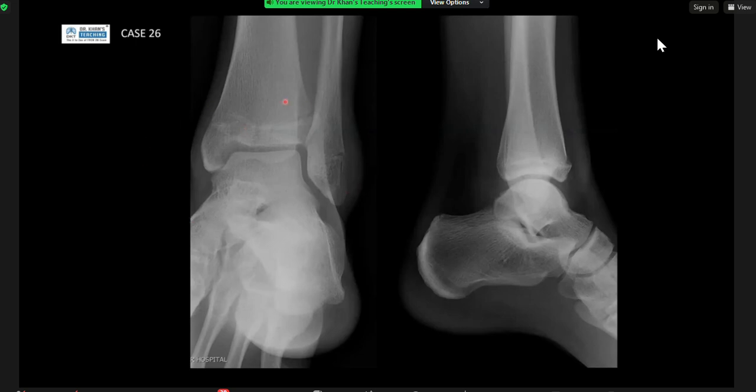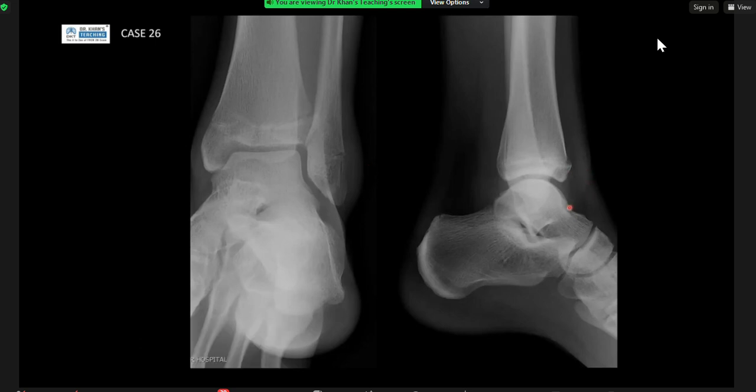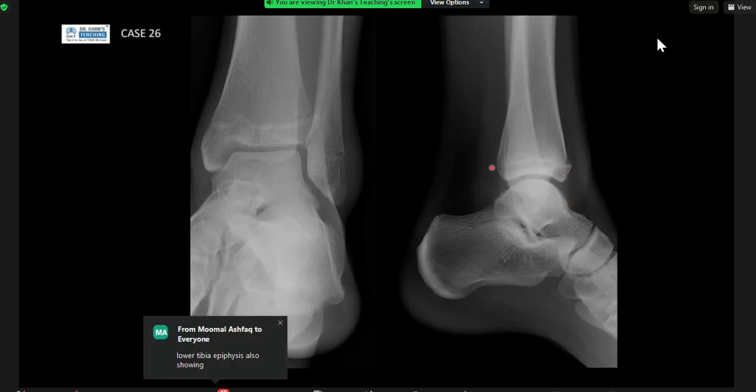So there is soft tissue swelling, okay? Certainly on the lateral aspect, maybe you can say a little bit on the medial, just because to my eye, they look a little bit more full compared to normal fat. But there's definitely more on the lateral side. I usually take an eyeball, subjective measurement. So this is quite small and this is big. So you say more on the lateral side. Same goes for joint effusion. You're seeing bulging of the anterior capsule and bulging of the posterior capsule. So there's a large joint effusion.